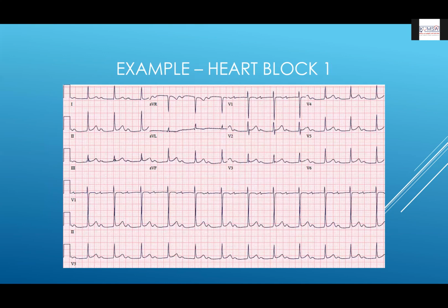So this is the first example of a heart block. I'm just going to give you a moment to take a look at it.